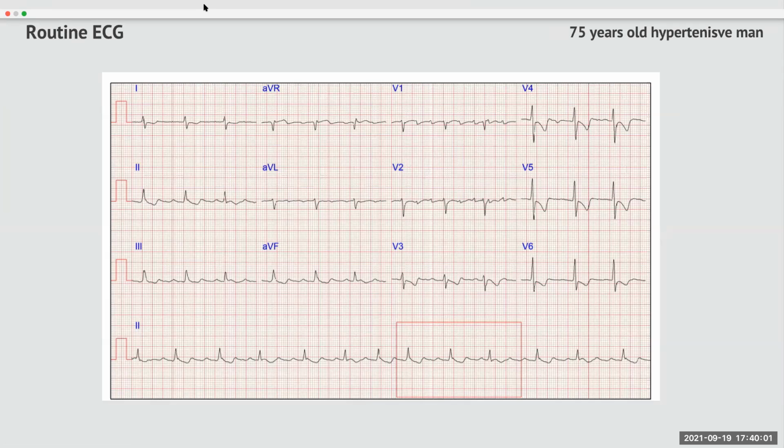There are other differential diagnoses as well, which is multifocal atrial tachycardia, obviously, and then atrial tachycardia with variable block, which is not just atrial flutter. So an irregular rhythm with a narrow QRS does not have that many differential diagnoses. Now comes the third step. You look at the rate, you look at the rhythm, and now you're looking at the axis. So how would you calculate the axis?